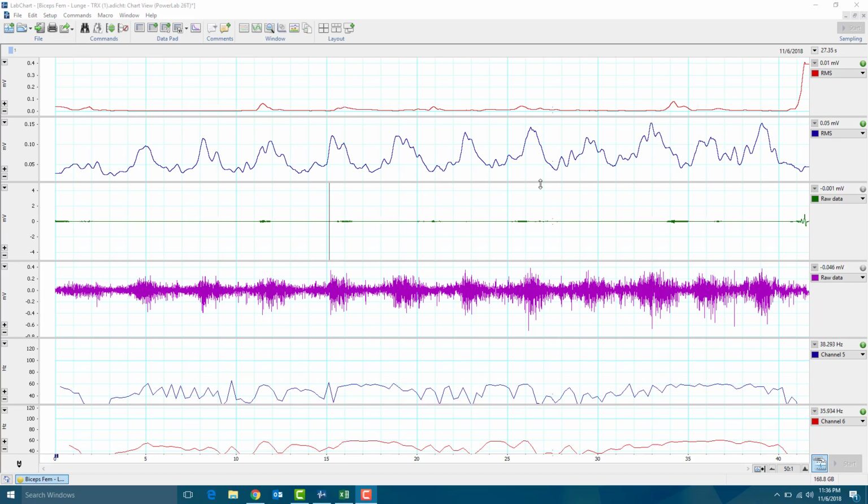You can see that there's pretty obvious EMG on this raw channel here, and our RMS, our second channel, is what corresponds to that. We have two real EMG channels always, channel 3 and channel 4. So channel 1 and channel 2 are what you're going to be getting your data from respectively. Obviously this person did not have channel 3 on, there's nothing on it as you can see. So we're going to be looking at the RMS averages from channel 2.